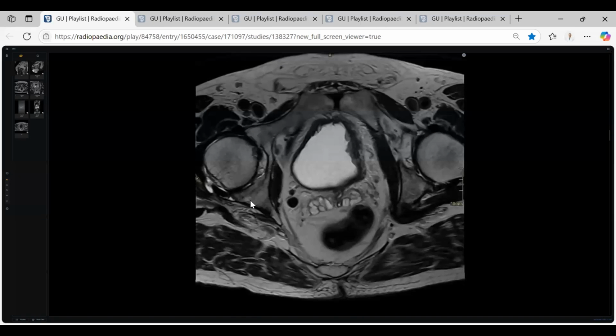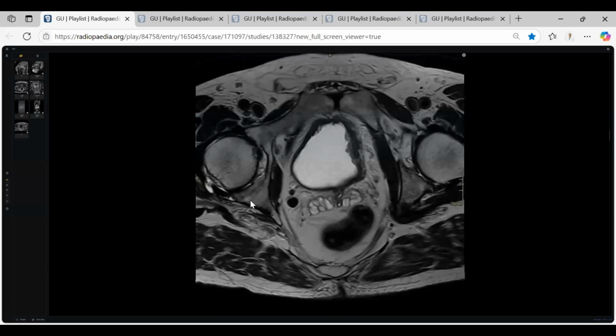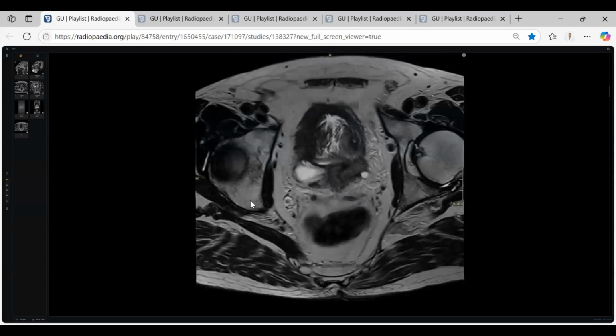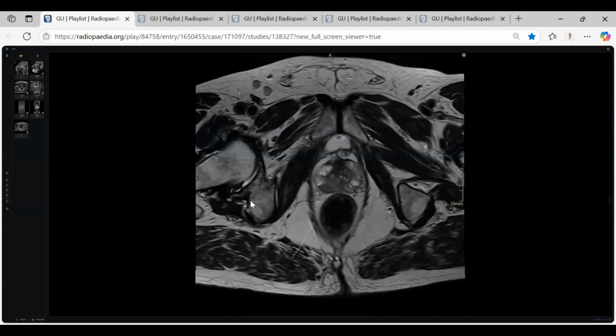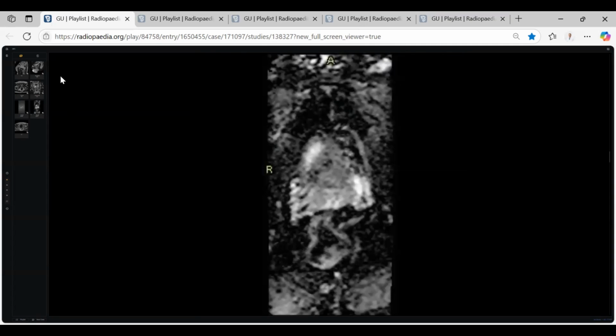Okay, so this is not invasion or a metastasis from the prostate. This is synchronous urinary bladder cancer and prostatic cancer. What's your next step, doctor? I will alert the physician about the findings, recommend correlation with the PSA, and check if there is any previous imaging.